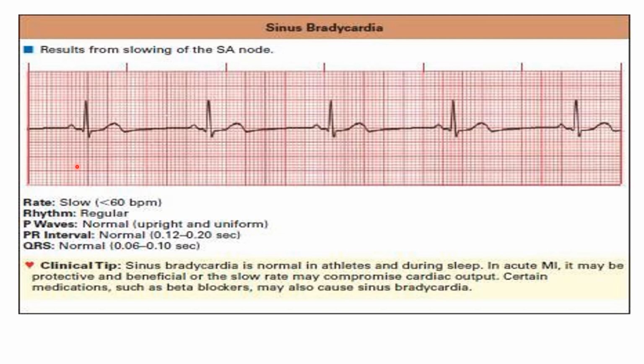Then we count our heart rate, how many QRS complexes we have in the ECG strip. So we have 5 here. We will multiply it by 10. So we have a heart rate of 50. We also need to know the atrial rate, from the P waves. We have 5 P waves here, so these are equal. So we have a heart rate of 50.